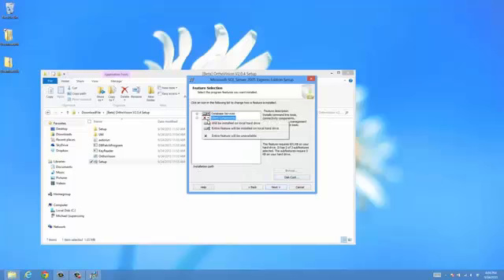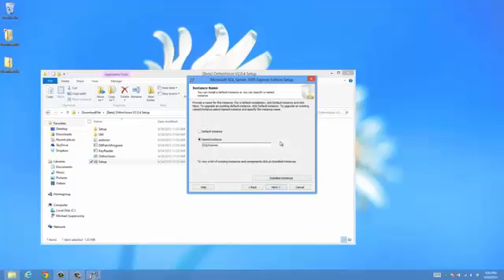You need to make sure that under Client Components, you click on the entire feature will be installed on the local hard drive before you continue. You'll see that the icons are all switched to little hard drive icons, and then you can click Next. On the next screen, you can name your instance of your server. It really doesn't matter either way.